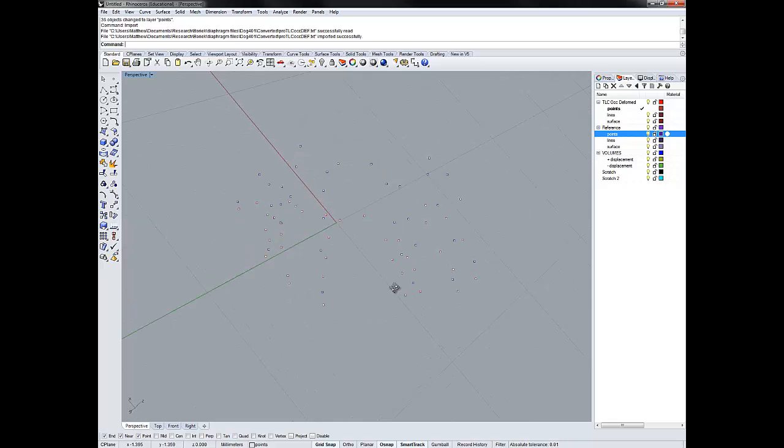It may be difficult to see now, but what we're going to do with these points is connect them to create lines. And right here, and right here, and right here, and right here are where we have the lines that we're going to be connecting. And as we work through the data, you'll begin to be able to visualize these points. I know they look very confusing now, but it'll become very clear very soon. So I'm going to work with the reference geometry first, and I'm going to create lines and a surface so that you can see that. And then we'll go back and do the deformed.